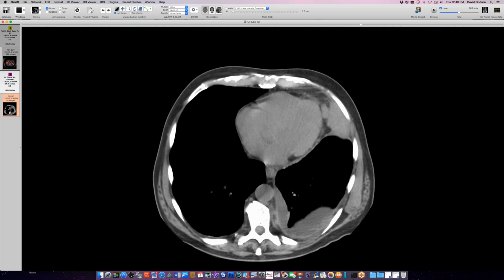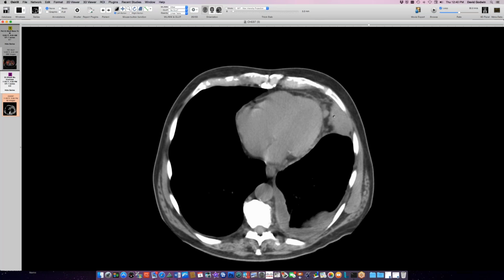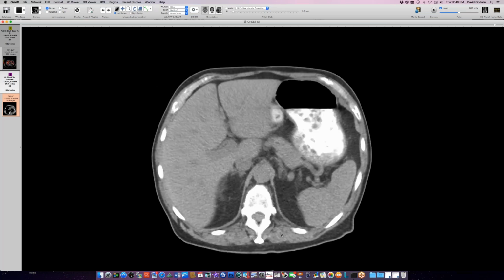This fellow did have a pleural plaque on biopsy, so he did have asbestos exposure, but he's got pseudo mesothelioma. So here's one of those little nodules that gets into mediastinal fat from the adjacent pleural tumor. Again, this is a really good pattern for meso, and we should scrutinize these intercostal nodes in this person to see if there's any evidence of that. In this case too, I didn't do that so far. Okay, so pseudo mesothelioma. That's a really interesting case.